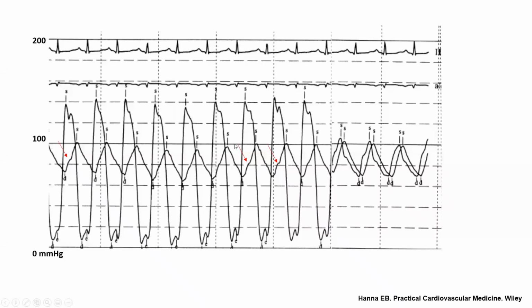If you get a long RR interval, the gradient will be higher. Simply, the idea is that a long RR means long preload and more stroke volume, and larger stroke volume causes a higher gradient. Gradient is proportionate to flow by definition using the Gorlin equation. So a long RR in atrial fibrillation will cause a higher gradient. The common wisdom and the common recommendation in textbooks, as well as in the ASE echo guidelines, is to average the gradient in atrial fibrillation across 5 to 10 beats.